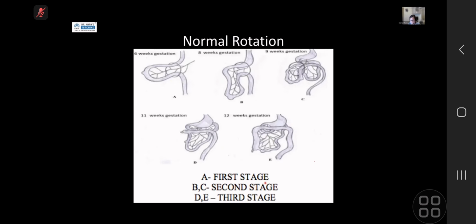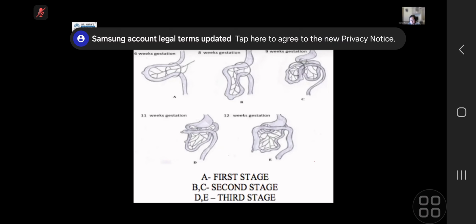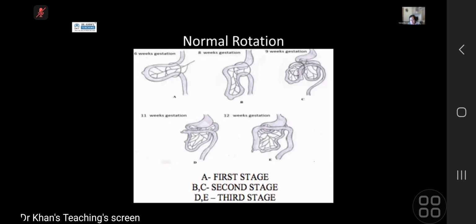Duodenum redundant: essentially you've got a redundant duodenal loop in the first superior part of your duodenum. So they talk about an elongation of the duodenal cap. On your upper GI contrast study, you don't see the classic shape of your D1, and you get a bit more wandering. You get a few more duodenal loops in that region before it finally goes across the spine into the normal expected position of your DJ flexure.